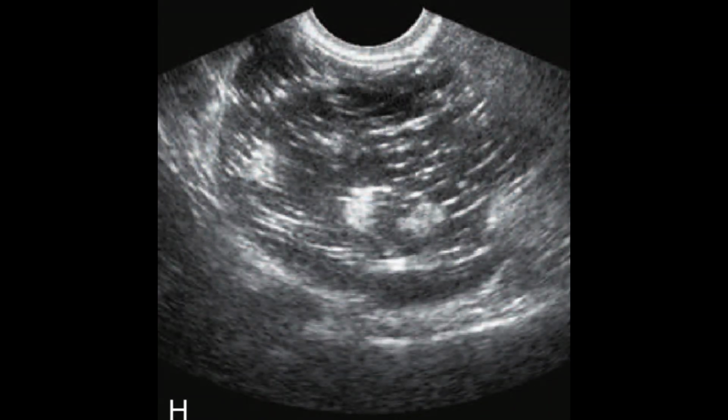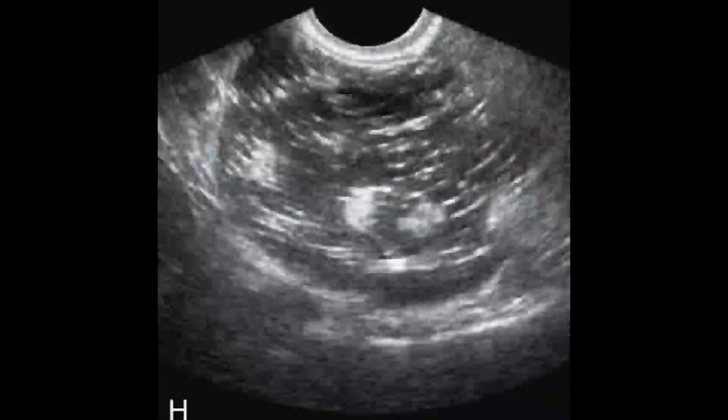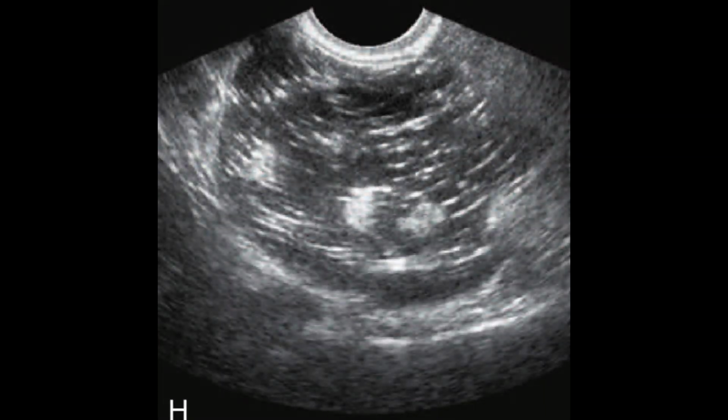But if you are focused, and beside your ultrasonic imaging you are asking the relevant questions, and beside this you are also palpating the area. After palpation, if you come across a solid mass, and on the basis of this examination you correlate with your ultrasound finding, you will ultimately reach the diagnosis that this is a dermoid cyst.